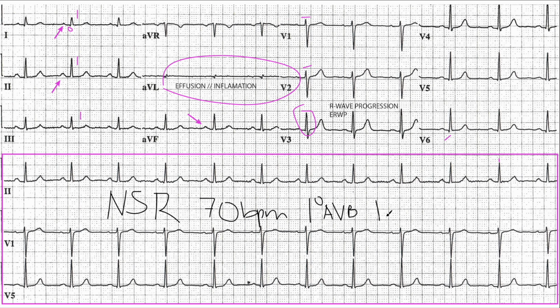What am I forgetting? I am forgetting early R wave progression and this lead AVL. So when you hand this over to a physician, or when you run it up the chain of command, if you say normal sinus rhythm, 70 beats per minute, this ECG will probably get ignored or taken a look at later than it should. However, this AVL here by itself, that is very, very significant. This needs to be brought to a physician's attention immediately.